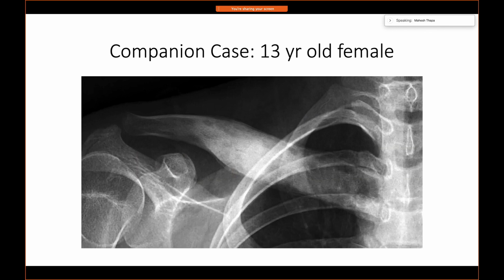So, clavicular lesion, except here it's more the medial aspect of the mid aspect. There is some periosteal reaction. I think it looks a little bit more mature. There's more sclerosis and lucency sort of intermixed. I can't really see a big soft tissue component. Very superficially it sort of looks like the other lesion. What do you think the diagnosis here is?